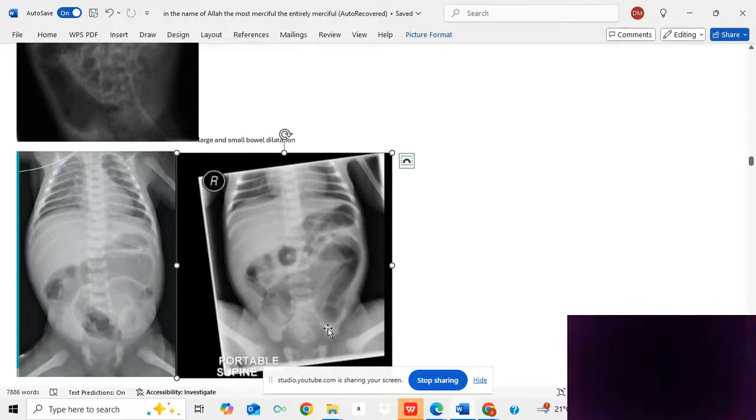crossing at lower levels, but it's a hugely dilated bowel loop due to a problem in the large bowel. I will mention this case later on. Okay, there's air in the bowel wall here. That means that this bowel loop is ischemic, so it's not functioning right now. So this bowel loop is trying to push its content inside the large bowel, which is non-functioning, so it's hugely dilated here from the accumulation of fluid.